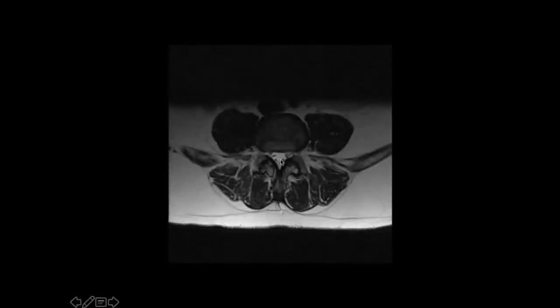When I come down, this is a narrowing of the spinal canal, but again, the CSF space is well maintained. So this would still be classed as, if anything, just about mild, or just causing indentation of the thecal sac. For me, moderate is when the nerves have just a little bit of CSF space between them. A severe one is when I completely lose any CSF within the spinal canal. So that for me would be severe spinal canal stenosis.